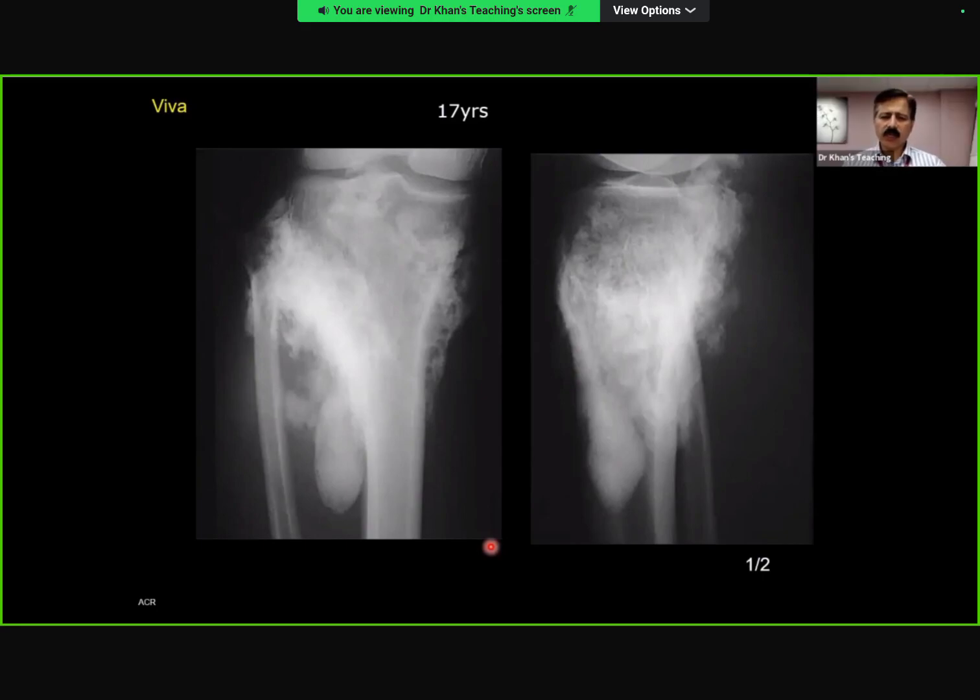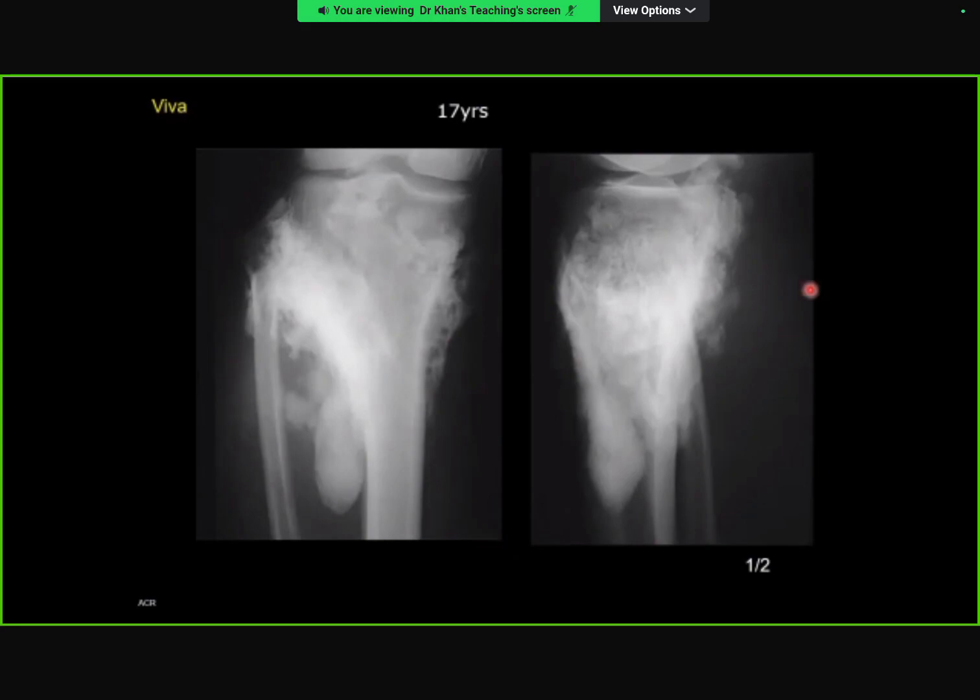Okay, so you described it, some debate came to your mind as far as chondroid matrix versus osseous matrix. Can you revisit that? What were you considering? Well, just in parts of the lesion, so for example, on the frontal radiograph, the inferomedial aspect, the calcification appears somewhat septated or ring and arc-like. Mm-hmm. So I just wasn't sure how best to classify this matrix, and if it classifies as one or the other, then we have to consider whether this is a malignancy of chondral origin. Mm-hmm.